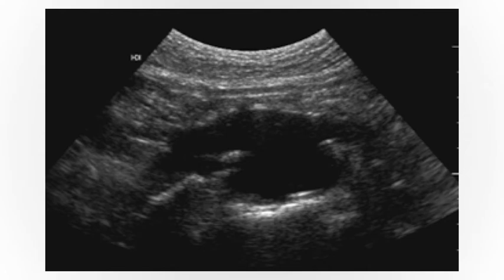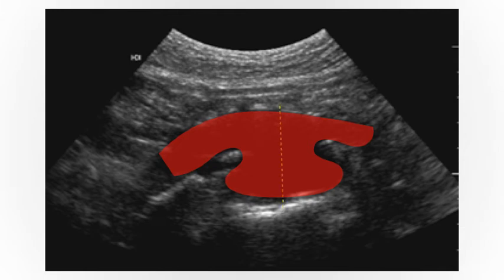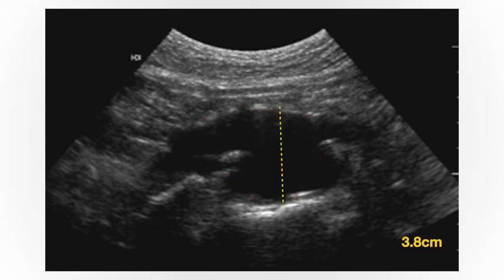Finally, what do you think about this one? If you diagnosed a posterior saccular aneurysm in the sagittal view, then you are correct. Notice how the aorta size on either side of the aneurysm appears normal, but this large aneurysm is hanging off one wall.